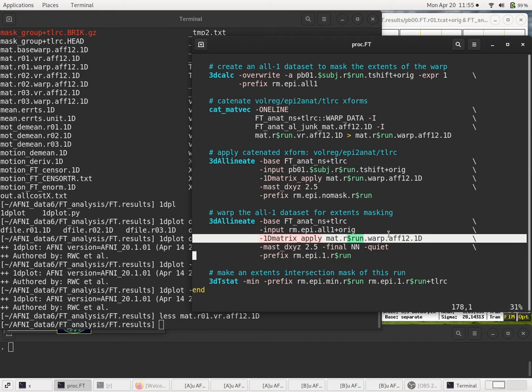Even if most of the time series is great, you can't include these big spikes that go to 0, unless like a miracle occurs and that happens to be a censored time point. But in that case, we're not really looking for that. If you get really lucky and you lose only a censored time point, you wouldn't really need to remove that volume.